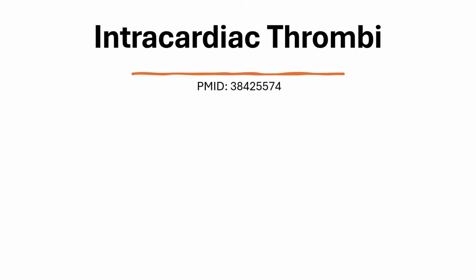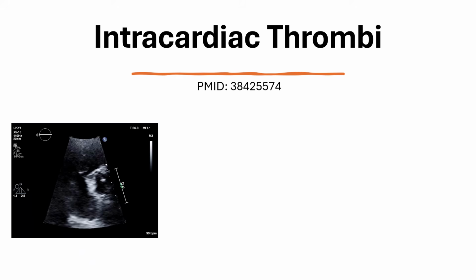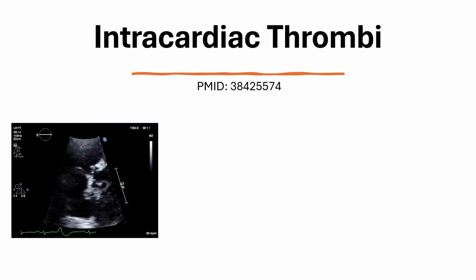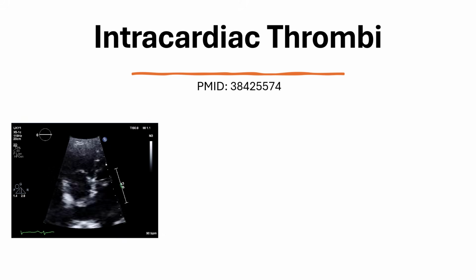As we discussed earlier, the presence of intracardiac thrombi is a very insensitive finding on echocardiography. However, when present, it gives you almost 100% specificity and positive predictive value for acute pulmonary embolism in the right clinical setting. Here you have a parasternal short axis view at the level of the aortic valve, where you see that there's a large mobile clot burden within the right atrium.